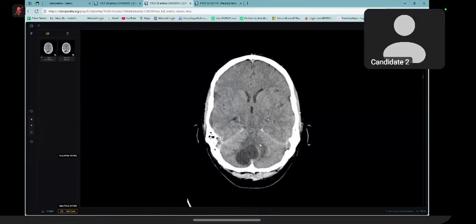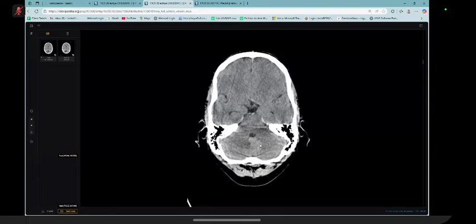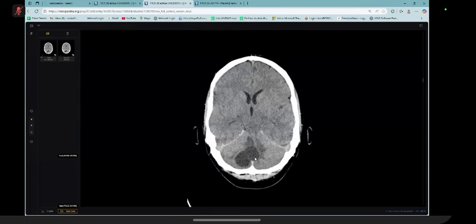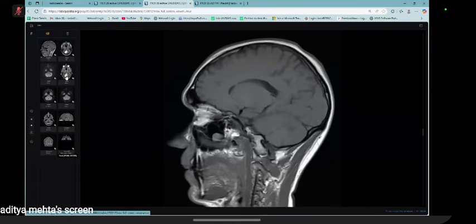Further, I will suggest contrast enhanced CT or MRI in this case to further see the wall enhancement in the cavity. I will give you the cerebral MRI. You requested me MRI. We have MRI. I'll just give you MRI. Okay, this is the sequence for you.